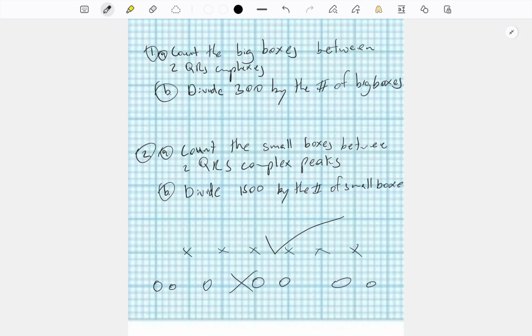They're taking the same amount of time, so therefore you can just do a calculation and estimate how many you'd have in a minute. Versus if the cardiac cycles are occurring irregularly, that wouldn't work, right? Because some are happening faster than some, as illustrated right here. Okay.